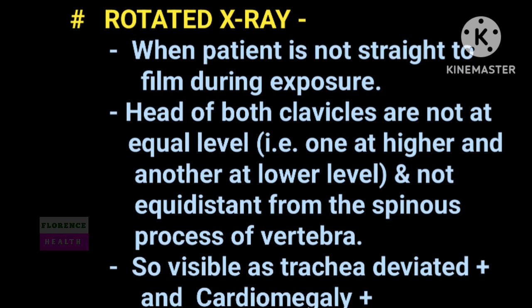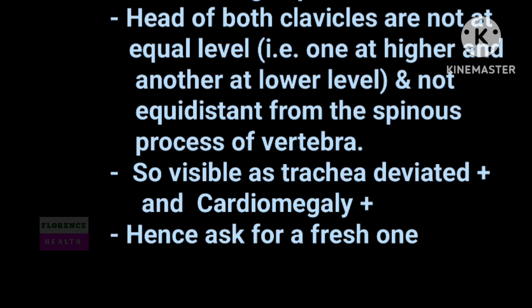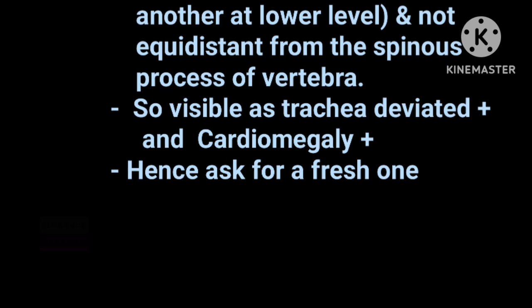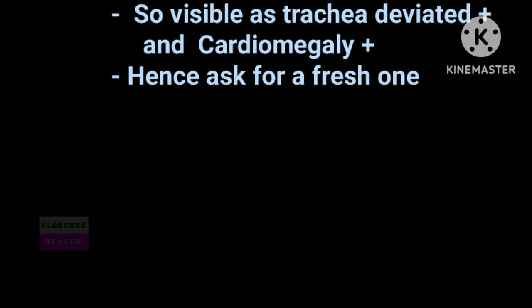On the other side, a rotated X-ray arises when the patient position is slightly rotated during exposure. Second, the heads of both clavicles are not at equal level and they are not equidistant from the spinous process of the vertebra. That is why it falsely diagnoses trachea deviated and cardiomegaly present. In this case, you will ask for a fresh one.